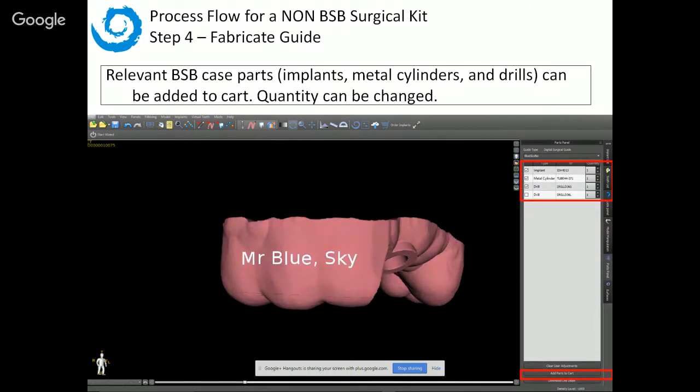In the advanced mode, we have a dedicated parts panel. Before, you clicked order parts and it opened up the website. In advanced mode, we've added in an extra step. Again, more control, and a little bit less streamlined, but the trade-off for more control.